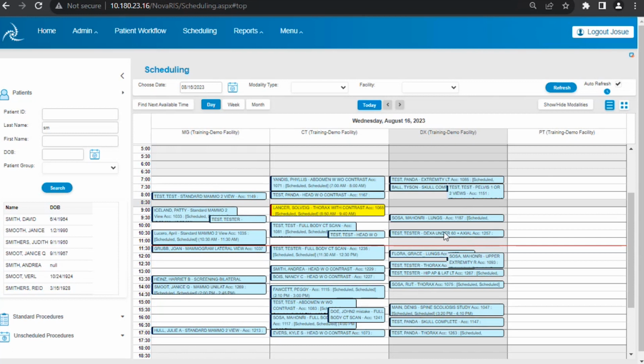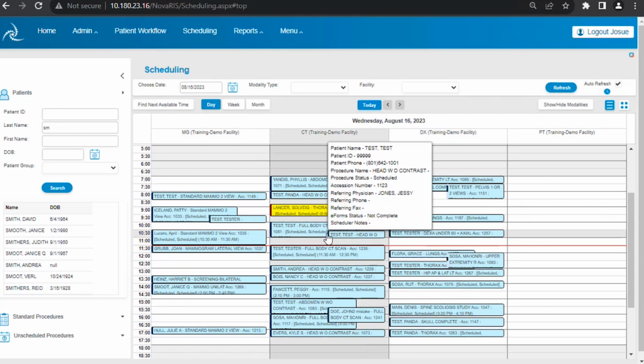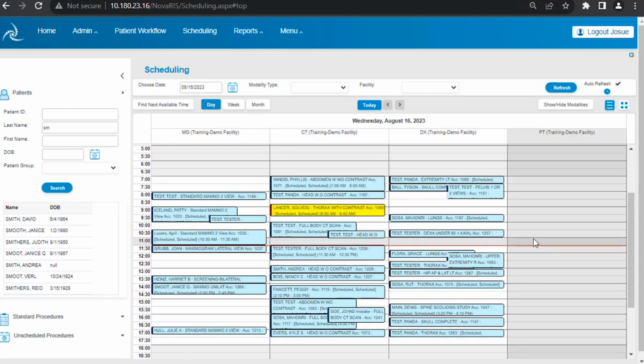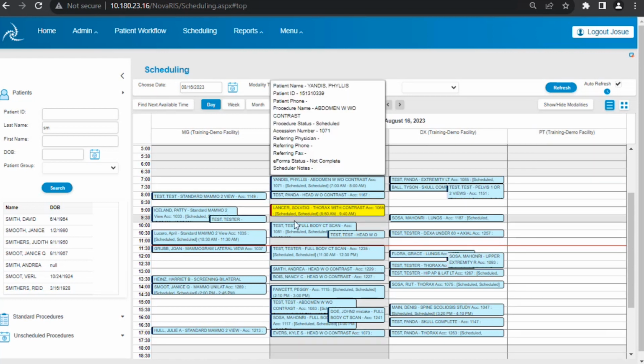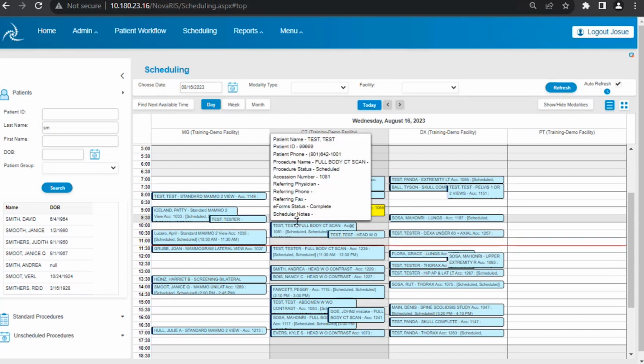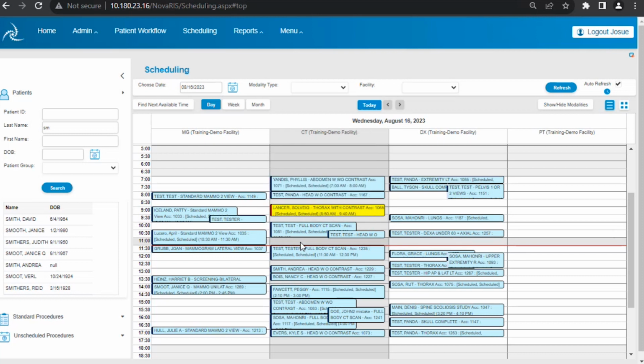And you can see that we have some of these extra schedules here where one is overlapping with the other one. This is to show you that you can still do that, especially if you are in an emergency. Normally, most hospitals will like to have no procedure overlapping with another. You will want to have it very clean, very nice, so that you know what times you really have available and what times you really are full and you cannot attend any extra patients.